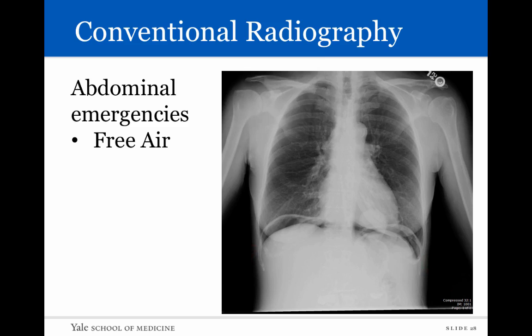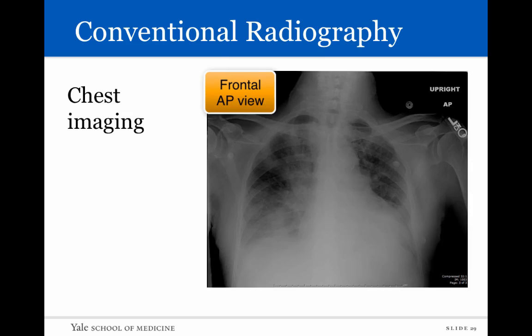And finally, it's very useful in day-to-day chest imaging, particularly in patients who are placed in the intensive care unit. Often they get pneumonias, they get aspiration, they have too much fluid overload, and so chest x-rays are a very good way to look at that on a day-to-day basis. This patient has a lot of whiteness in their lungs, suggesting there's some fluid or infection that has infiltrated the lungs.